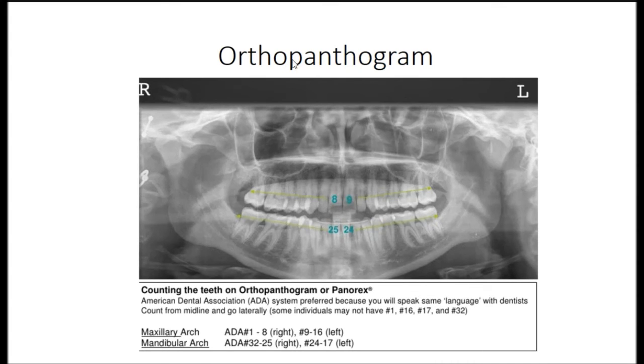And then this is the orthopantomogram, which a lot of times we're probably not going to be able to do in a mobile industry, but you still may do it in a hospital setting. Some urgent cares, things like that, may have access to this view. It's really good at looking at the mandible for fracture. So we can see everything on this view: the mandibular condyle here, the angle of the mandible, the ramus of the mandible, the mental process, and coming all the way around.